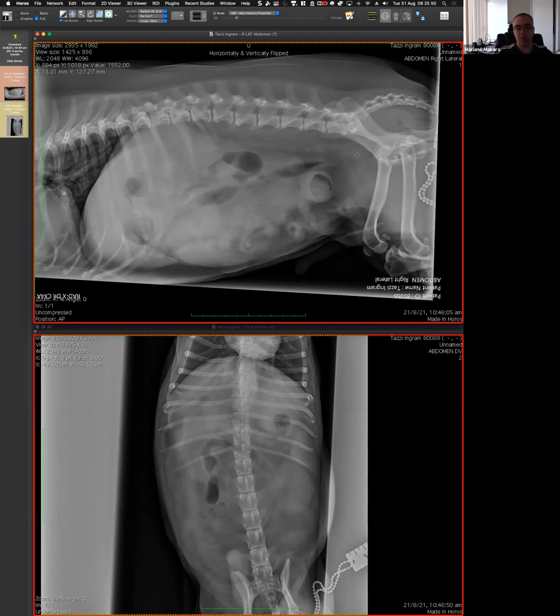And now you are going forward. You are saying, if that is small bowel, I expect it to be more gas filled. I would expect an accumulation of fluid or gas in the rest of the small bowel, and I don't see that. I'm perfectly fine with the definition of the problem.